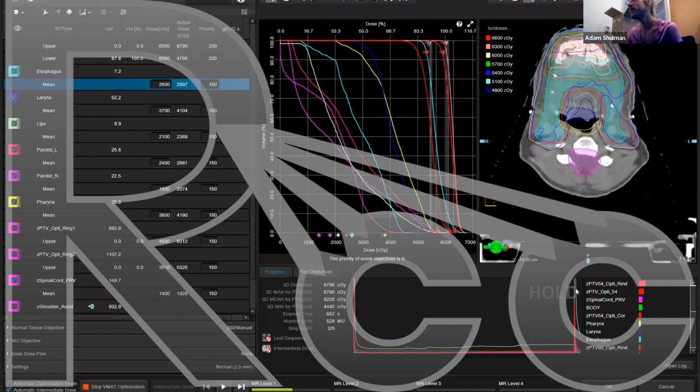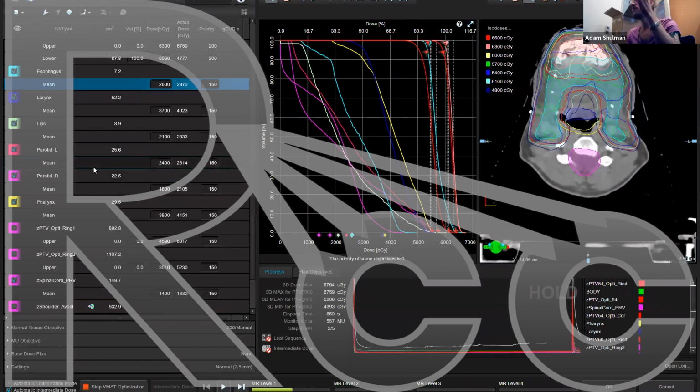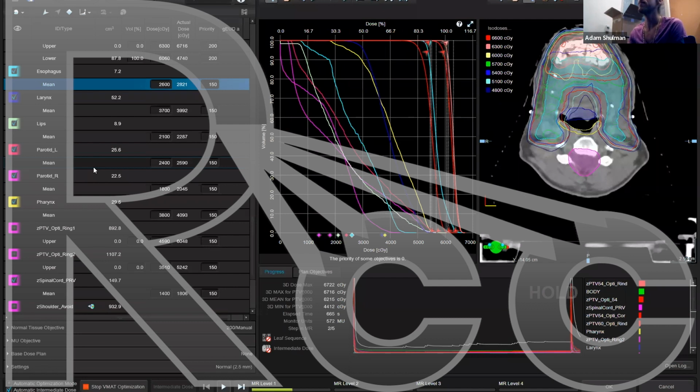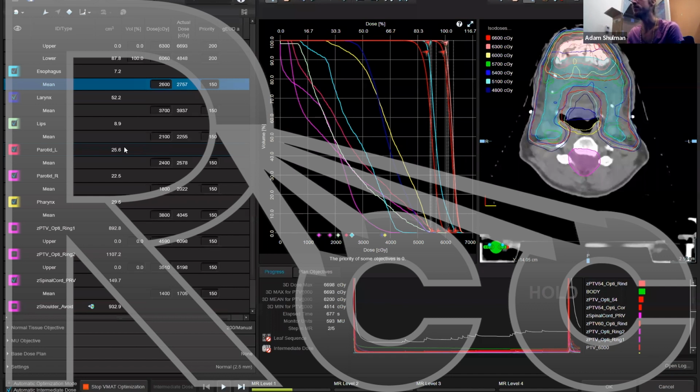That's because in Eclipse, there's sort of the interpolation by going from a few static fields with segments of MLCs and moving to more fields along my arc angles. And now it's redoing those MLCs between the two sort of gantry positions. Again, we're just increasing the number of degrees of freedom as we go in this Eclipse system, but the same concept of major motions to smaller motions.